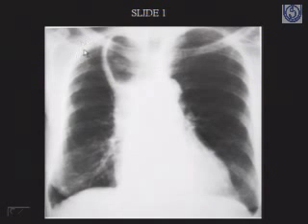First of all, whenever you see a pathology in the lung, you have to see whether it is parenchymal or extraparenchymal, that is pleural, extrapleural, or mediastinal. So is this linear opacity parenchymal, or extraparenchymal, that is pleural, or mediastinal? It does not appear to be parenchymal. Why do you say this is not a parenchymal pathology? Sir, because of the direction in which this opacity is running.